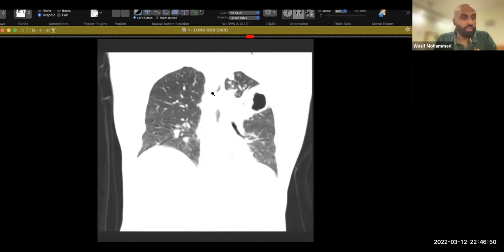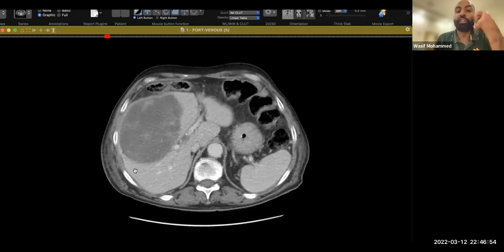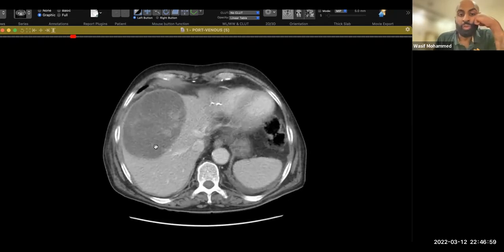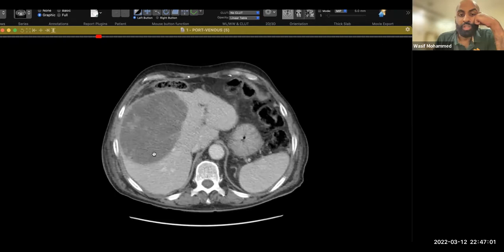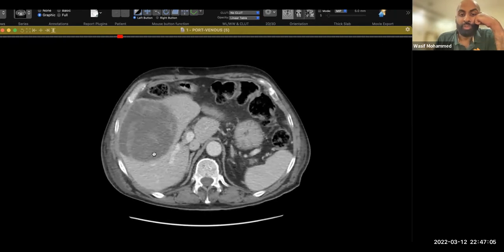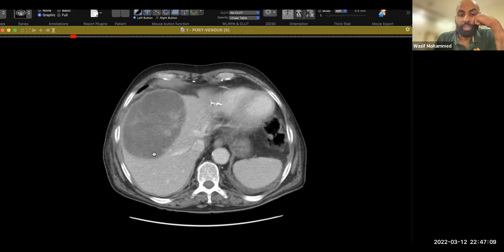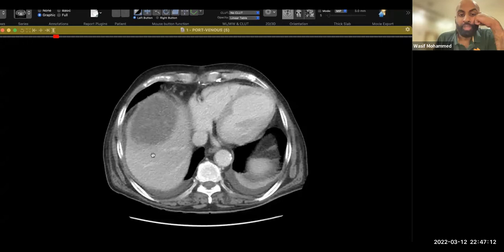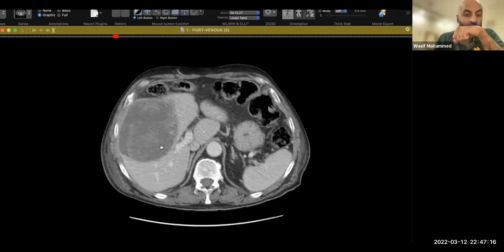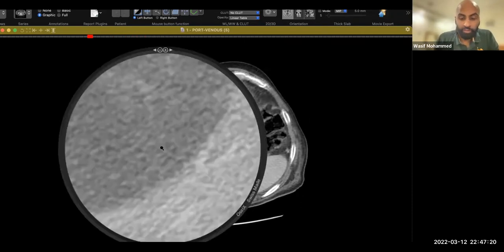So this case is a spotter for hydatid. These are enhancing septa in a cystic lesion, which is thin walled. There are no air foci to suggest an abscess. The patient did not have raised inflammatory markers or fever. So other than that, you can think along the lines of hydatid and say that I'm looking for daughter cysts or calcifications, which is not there, but overall the appearances are quite characteristic for hydatid.